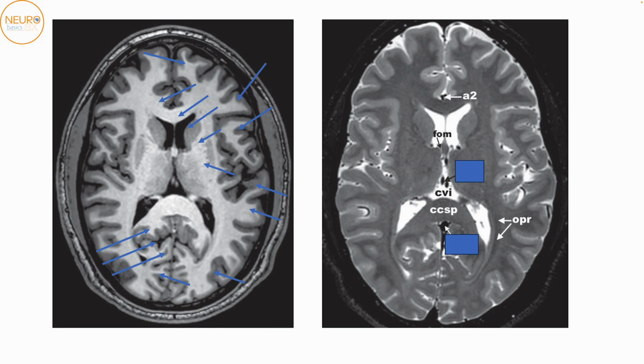Okay. So coming to the next level, slightly more inferiorly, you have a few hopefully now clearly more identifiable structures. Again, you have the superior frontal gyrus here, the middle frontal gyrus here, and the inferior frontal gyrus over here. Now the sylvian fissure has become a lot more obvious and demarcated. Okay, so this whole structure is the frontal operculum, which will include your pars triangularis and pars opercularis. Below which you have the insula. Over here is the insular cortex.